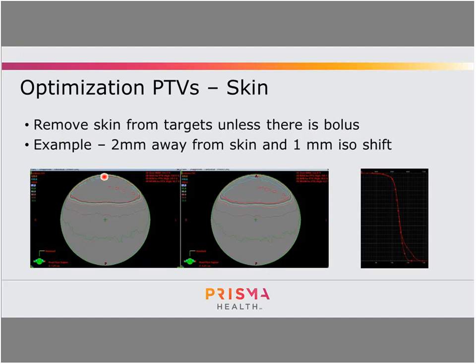So the way the optimizer fixes that is it puts in a lot of modulation coming tangent to the surface and just pumps in dose. So it comes in laterally, and again, it looks pretty good on paper, but what that doesn't do very well is transfer to a patient, because a patient's not going to be in the exact same spot.